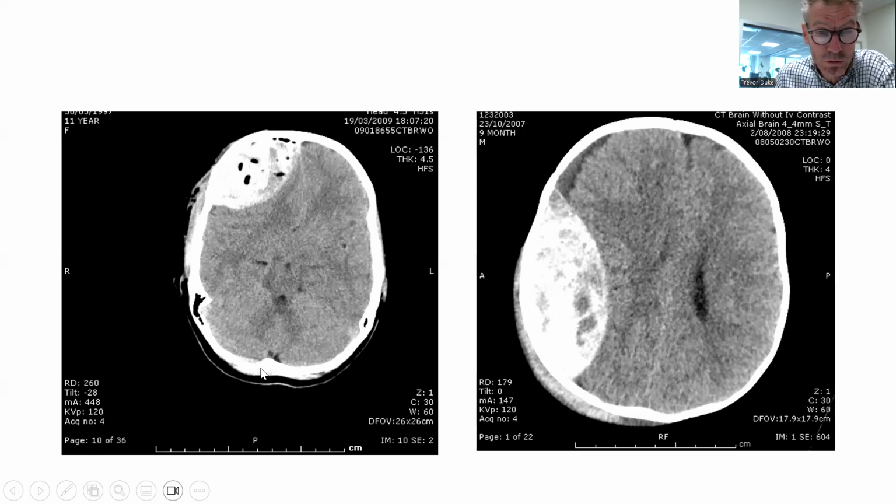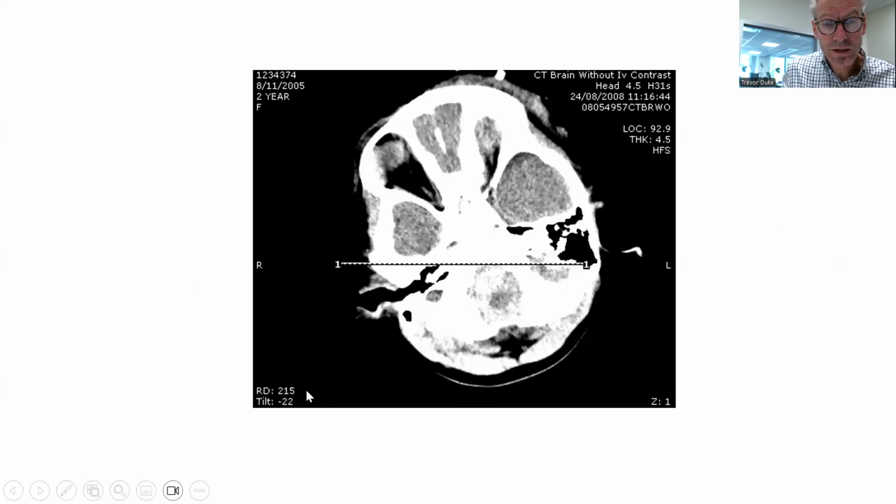You can't see the normal sulcal and gyral pattern. There's not a lot of cerebral edema there. There is a bit surrounding the extradural hematoma, as you could imagine. It will be there. But typically, if this is removed, then the brain will be preserved adequately. So we've talked about extraaxial bleeding, that is subdural hematomas and extradural hematomas.